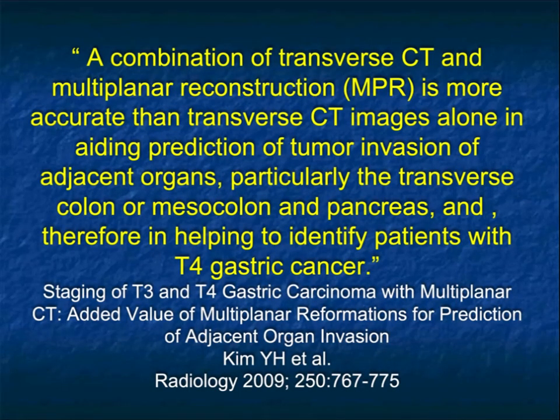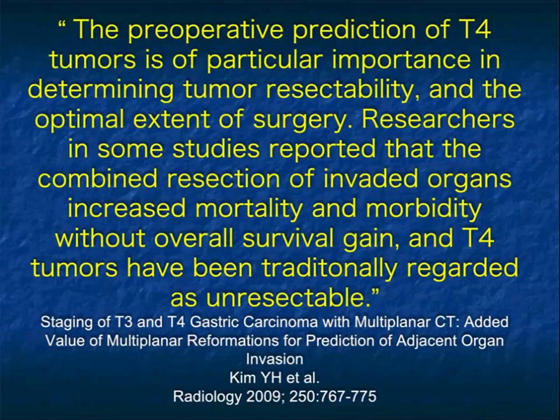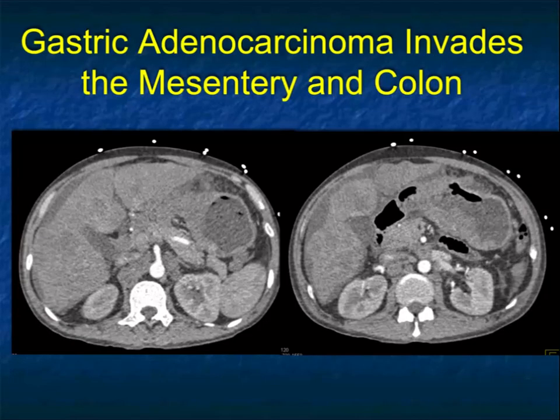In terms of looking at images, I've shown you some 3D and multiplanar. This article by Kim made the point that multiplanar is very helpful in defining extent of disease and in determining resectability. It's especially true with more extensive tumors.